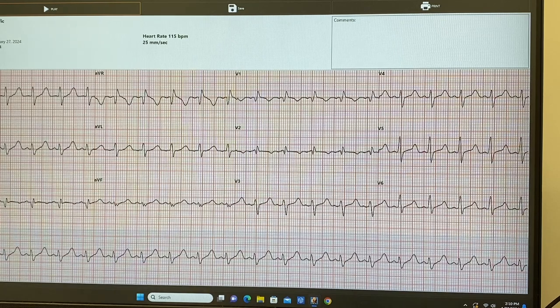All right, now we're looking for an ST segment. Not yet. You were into the PR. Our QRS complex. Good. It's narrow. All you want to know is that they're narrow. They're narrow, and each QRS complex at baseline is approximately one small box. So we have no ventricular problems so far that we know of.